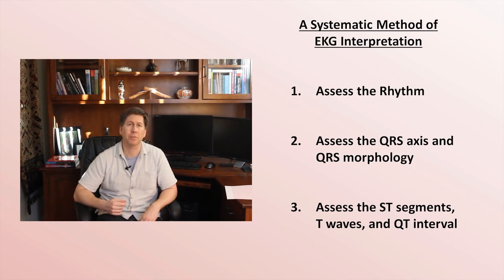This may seem superficially similar to Dubin's approach. However, this one focuses on individual waveform abnormalities instead of diagnoses. Among multiple benefits of this are that you won't forget that changes in the waveforms can be caused by things other than hypertrophy and infarction.